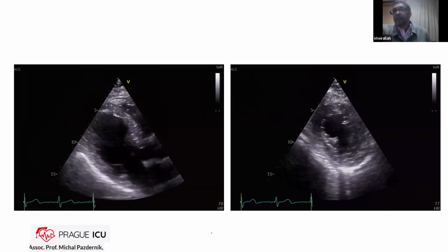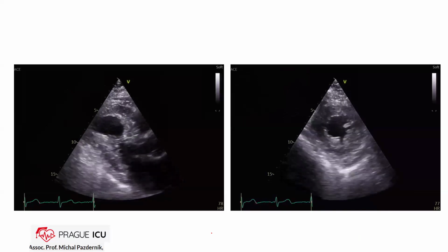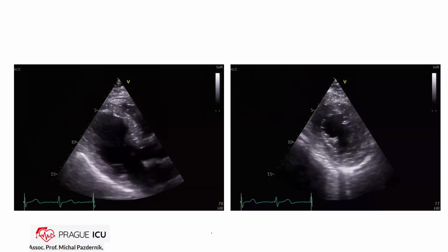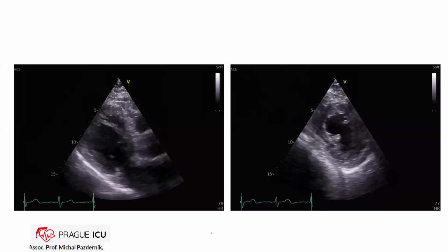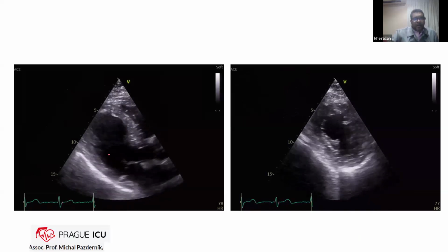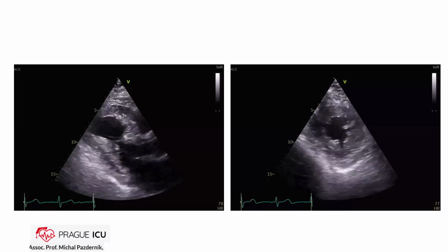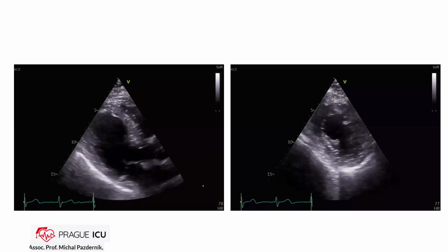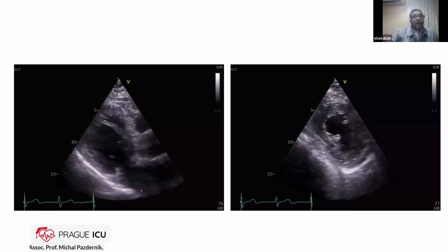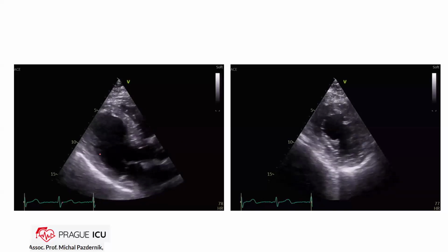Now tell me about this. What are we seeing here? LVH, severe LVH, and LV outflow obstruction. Okay, but very hard to decide about LV obstruction based on a single view like this. Hypokinesia. Where is the hypokinesia? It is anterior. Very good.